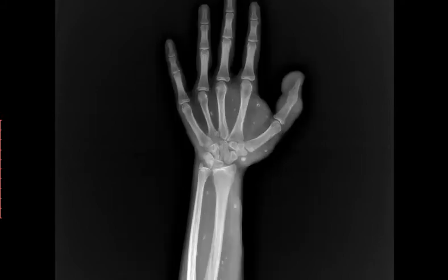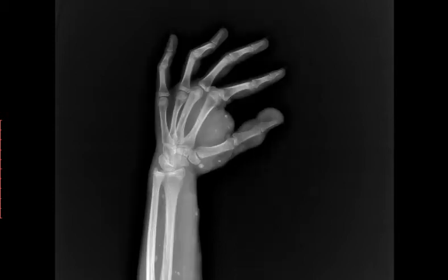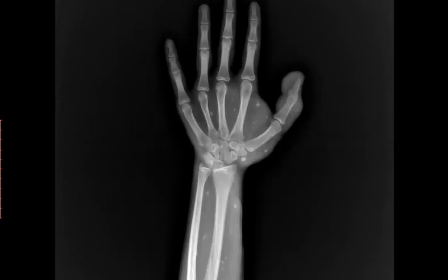Okay. Lower forearm. AP and distal lateral. Distal forearm, yes. AP and lateral. Well, it's oblique, not lateral. Yes, this is oblique. Showing. Let's stay on the AP.